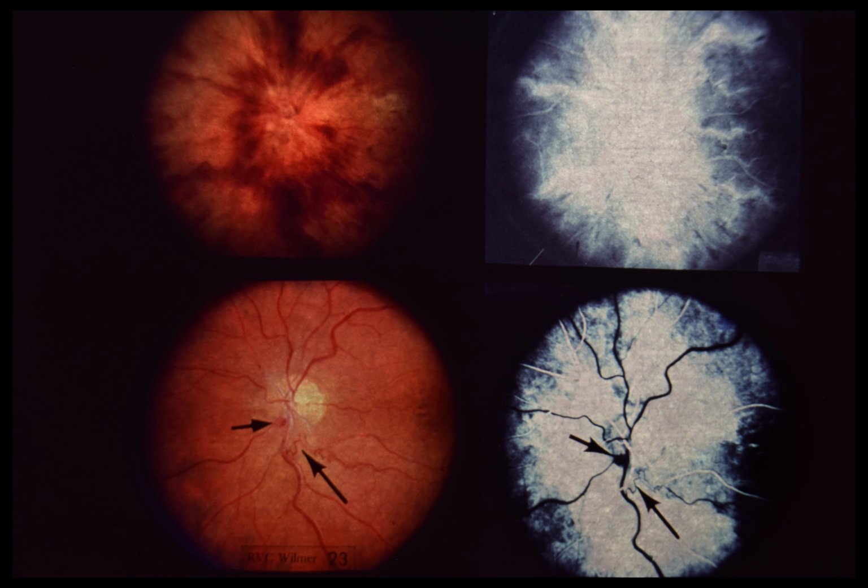Shunt vessels are present adjacent to the inferior temporal vein. The macula is no longer edematous, but has numerous pigment epithelial abnormalities. Lower right. During the arterial phase of the fluorescein angiogram, there is no filling of shunt vessels, indicating that they are venous to venous shunts. There was late filling of these vessels, but no leakage.